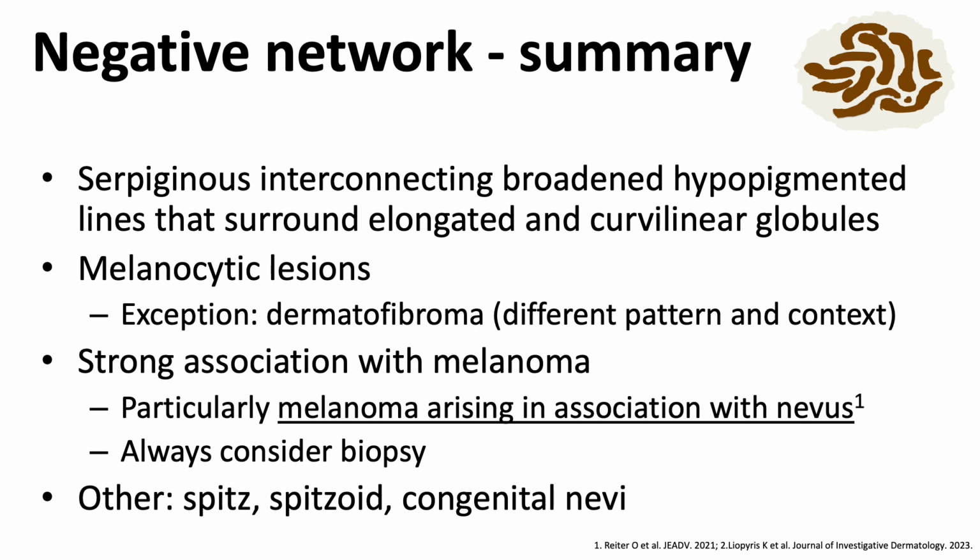There's a strong association with melanoma, strong enough that I would suggest any lesion that shows negative network, there should be a strong consideration to do a biopsy. And in particular, you see this feature in melanoma arising in association with nevi. You can see it in other subtypes of benign melanocytic lesions like Spitz nevi, spitzoid neoplasms, and in some congenital nevi.